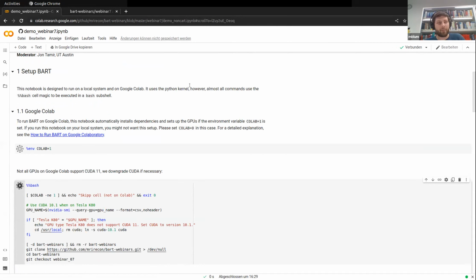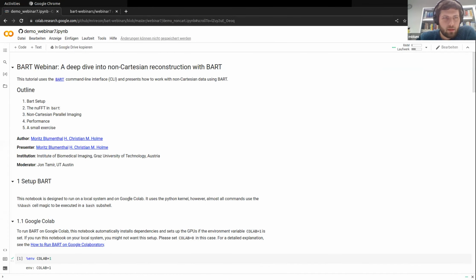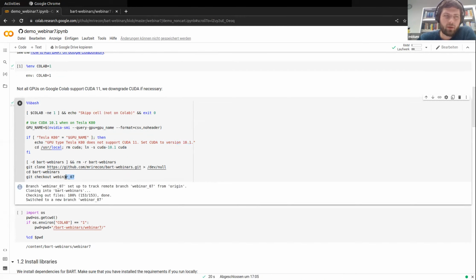Let's see. There are some issues with old versions of GPUs on Google Colab, which are not supported by CUDA 11, which is installed. If this is the case, we need to go to CUDA version 10. Also, what we do here is we check out the BART webinar.